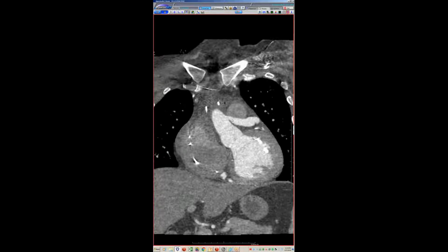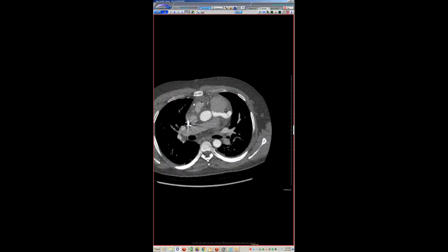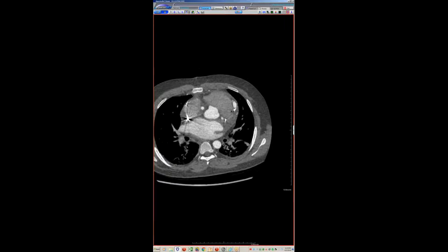So it starts at the aorta, goes through the pulmonary artery, and then they create an anastomosis with the pericardial baffle and the left main, which was attached to the PA here. So they literally create an intra-PA baffle using pericardium so that the aorta can flow into the left main.